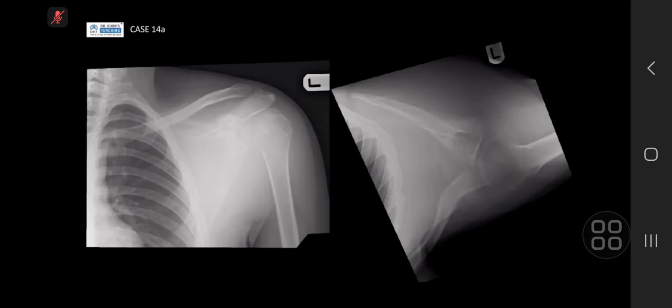Okay. In the axillary projection, I can see a lytic lesion in the distal end of clavicle and the humeral head, and also in the spine of scapula. But on the frontal projection, I see an increased density overlying the scapula, the glenoid, humeral head, and the shoulder joint.